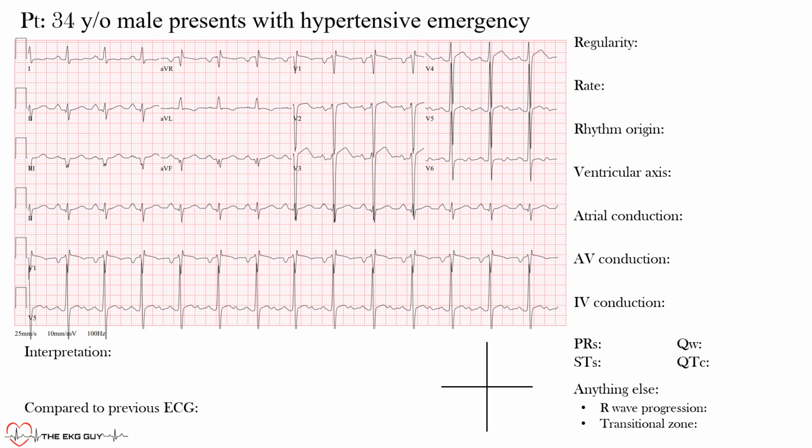So this week we have a 34-year-old male who presents with hypertensive emergency. Okay, and this EKG is shown here. Why don't you pause the video, take a moment to go through it yourself, and when you're ready, we'll walk through this EKG together.